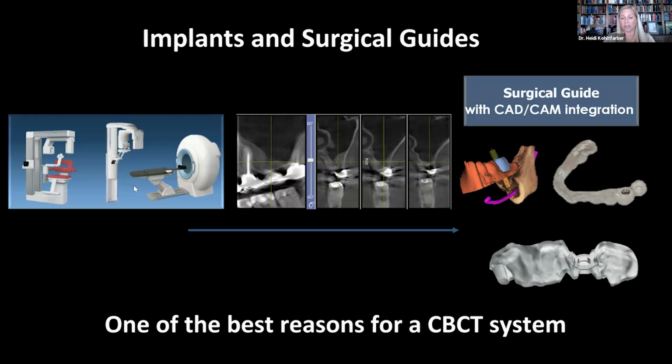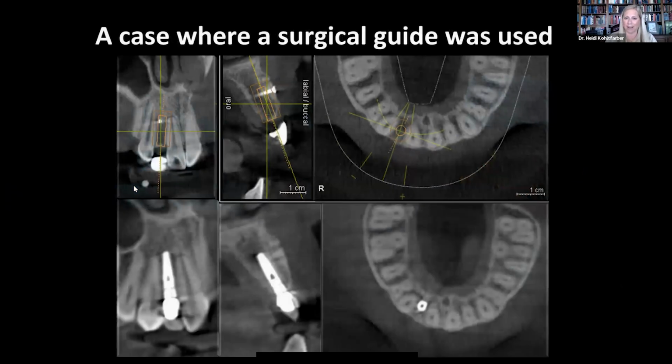So we actually did another pilot study with a different implant system because we thought maybe that was just a really good implant system. And the degree of accurate repeatability with those third-year dental students for that one was 0.03 millimeters. So these are pretty accurate, and I think that's just a great tool. I wish I'd had that actually when I was in general dentistry. It would have been quite helpful. So here's a case in which a surgical guide was used, very minimal space for this lateral, and you can see that the implant was able to be placed perfectly where it was planned.